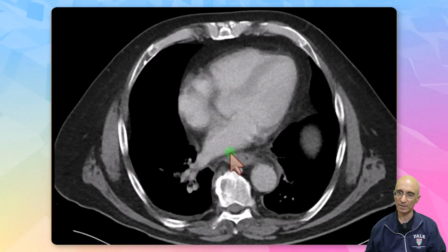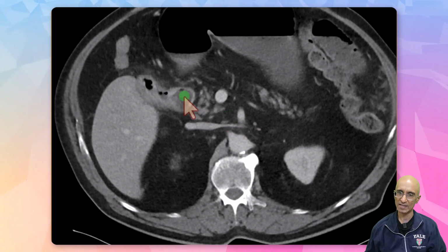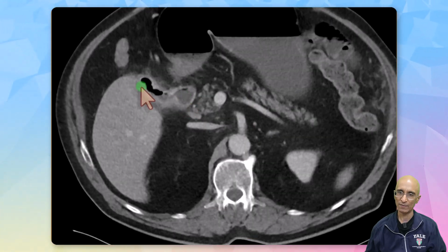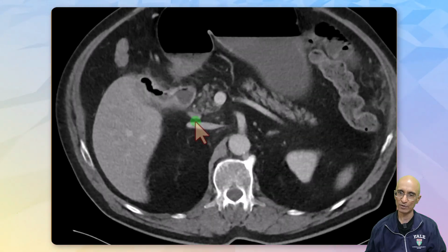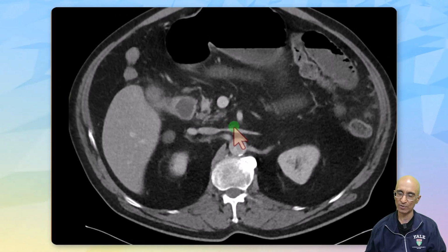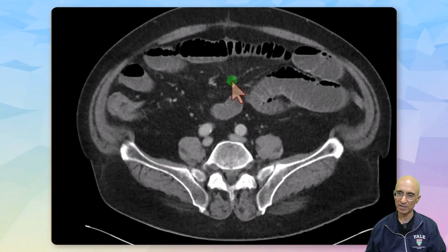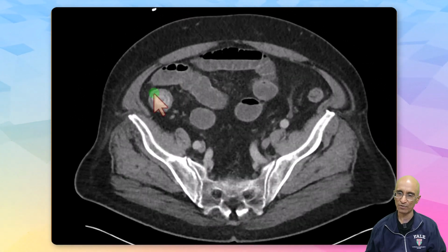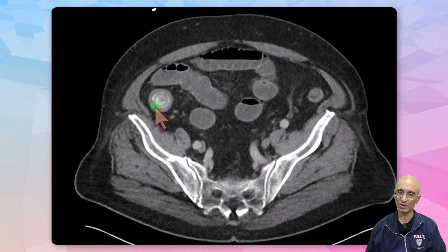On the axial CT images, as you scroll down, you can see stomach is massively distended, and we can see air within the gallbladder which is decompressed with mild wall thickening, and you can see a fistulous tract between the duodenum to the gallbladder. And as I scroll down further, you can see dilated small bowel loops consistent with small bowel obstruction, and a calcified lesion is seen within the lumen of terminal ileum, which corresponds to the gallstone which we saw on the old CT examination.